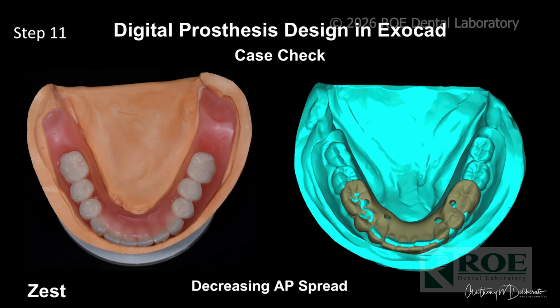So here's the design of the lower prosthetic. The blue is my denture setup, and even though I know I'm not going to have teeth all the way back, by setting these extra teeth, it helps me get the teeth in the right position, because I know that the arch form should follow the ridge. I know it should be two-thirds up the retromolar pad. So I set those additional teeth just to give the lab extra information. And also when I'm trying it in, it helps me confirm the bite better to have all those extra teeth.